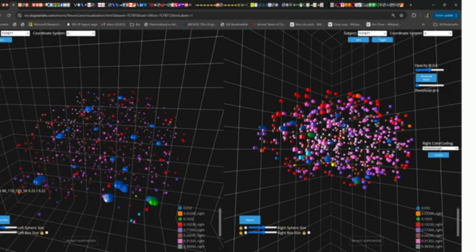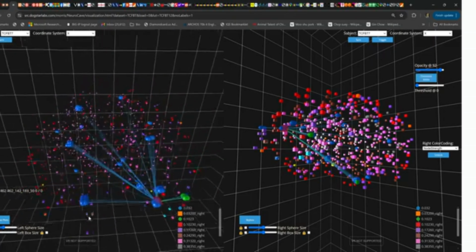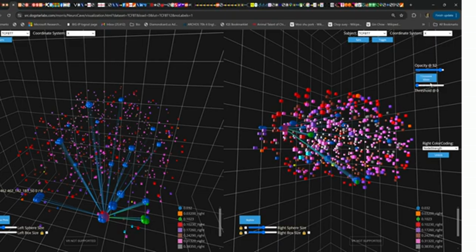the visualization doesn't show any connection edges between the tumor cells by default, but it allows the user to interactively click on tumor regions, and it displays those connections. You can adjust their opacity to make them more visible. By default, it's in a threshold mode that shows the connections that are stronger than a certain threshold. We can change it to a top N display cutoff that shows the top 20 connections. If we click on this tumor, we'll limit to only the top 20 connections.